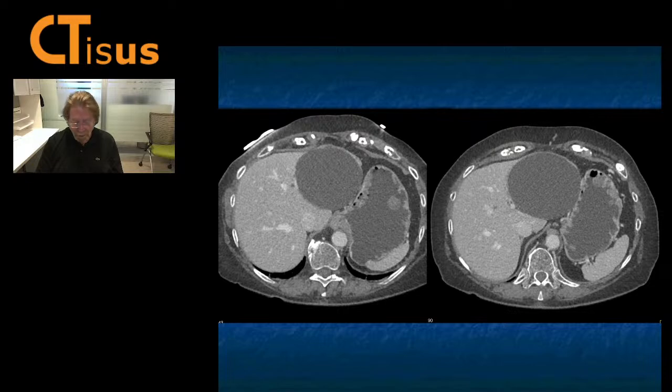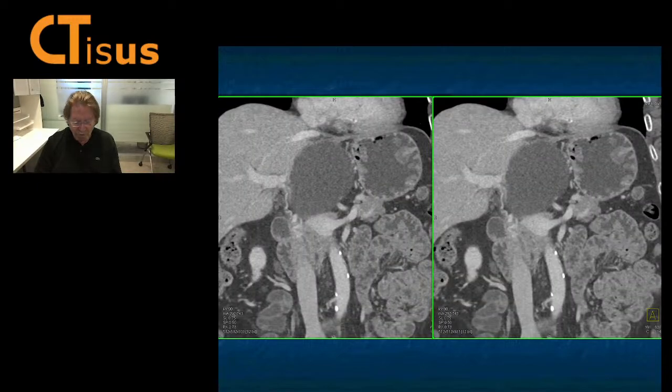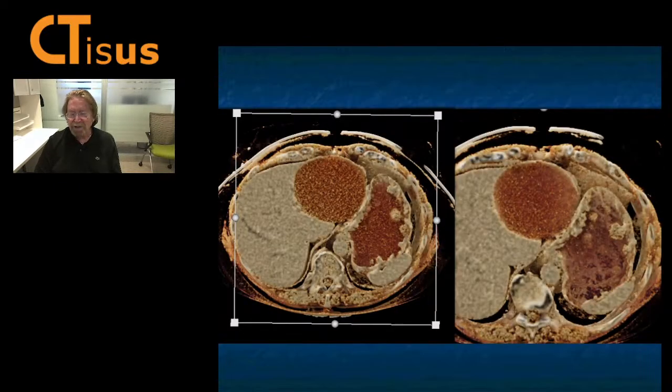So what could it be? Well, polyposis syndromes. But there the polyps are usually more solid, and they are multiple. I don't see anything else in the scan, though I only gave you a limited part of the scan. Here's a few more images in the coronal views, and you really get a very nice look at those polypoid lesions. And if I give you cinematic, you can see them standing out against the water. So one thing to remind you again, it's very important to give water to distend the stomach. If you distend the stomach, you can pick up polyps, whether it's single or multiple.